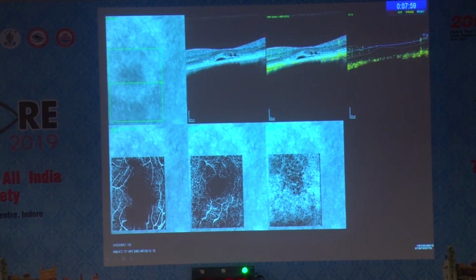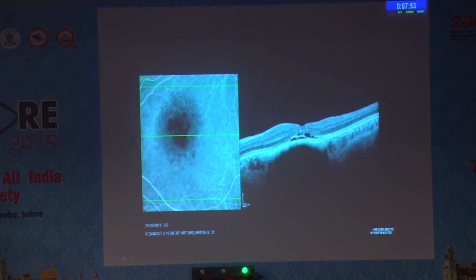One reason for that possibly is the choroid. If you can just show that back. That entire lesion, I'm presuming it's a nevus, has pushed out all the conventional choroidal vessels away. So there's no way that ICG dye is reaching that spot. You understand? Or probably very minimal. So otherwise you should have seen pooling. He's even shown us the very late frames. So the thing has been there for such a long time. It has probably killed all the choriocapillaris out there, and that's why you see it as black.